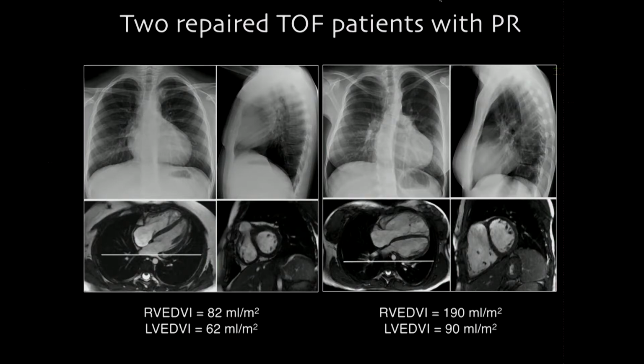Cardiac axis is maintained, and this is the posterior border. It is still in front of the spine, and in the lateral view, you have the cardiac silhouette in front of the spine. However, this patient has some rotation of the heart, and the posterior cardiac silhouette is overlying the spine here, and you see that protruding there. Okay, so surprisingly, in this patient, CT ratio might be 55%, but the ventricular volume is completely normal.